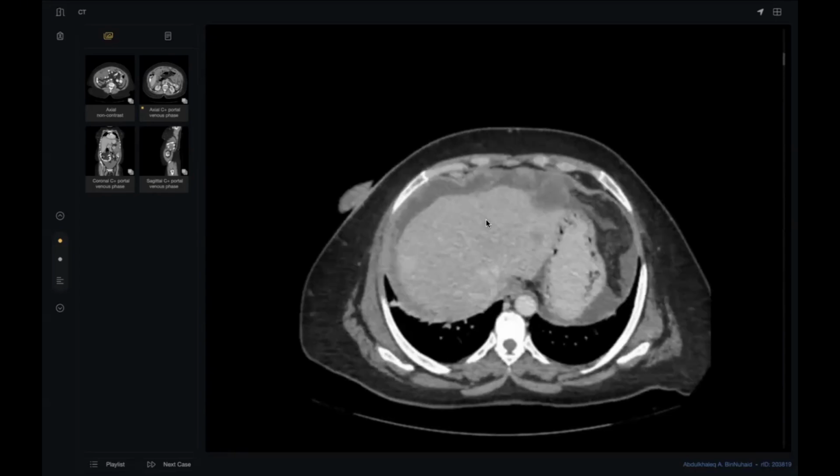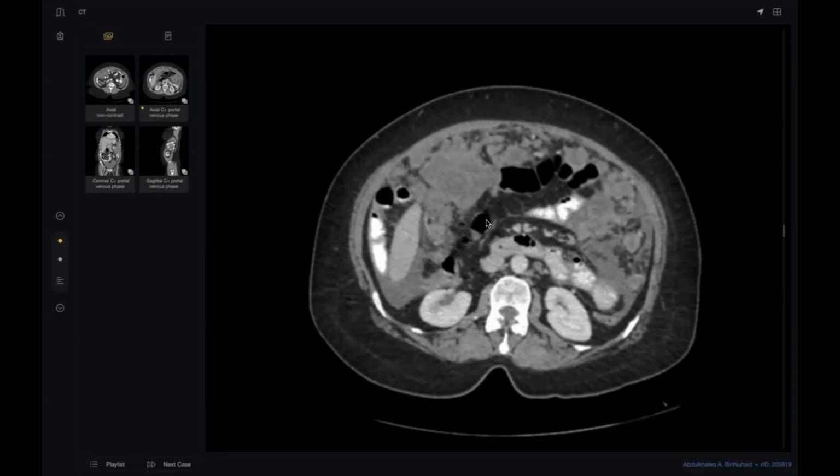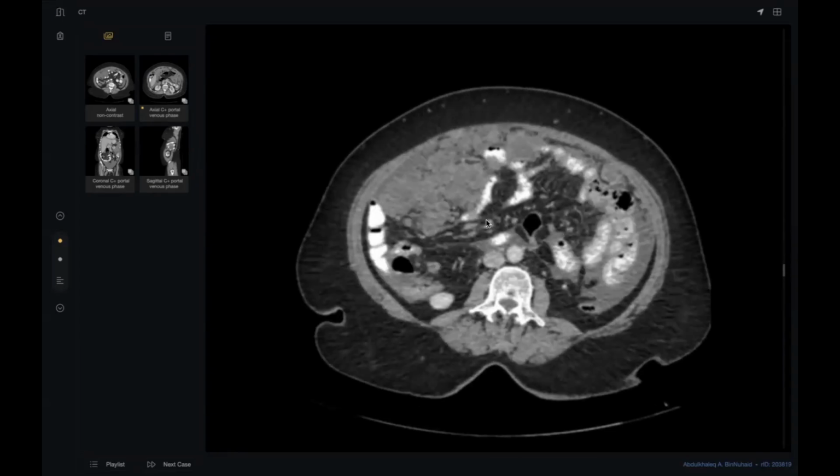Okay, doctor, if this is a male, what is the most common cause of this peritoneal and liver picture in a male? In a male, maybe testicular, Sertoli cell or something. Again, or pancreatic. This is a pseudomyxoma peritonei. What is the most common cause for a male? Mucocele of the appendix or adenocarcinoma. Base of appendix carcinoma. Yeah, adenocarcinoma of the appendix, whether in the base or in the tip.